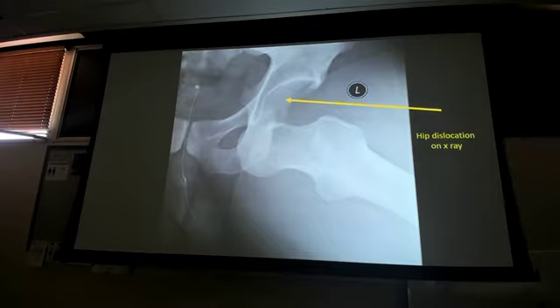What was your question? Yes, that is a urinary catheter for this patient. Good. What other questions do you guys have?